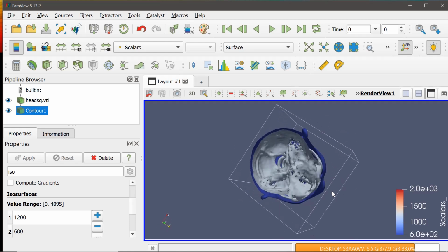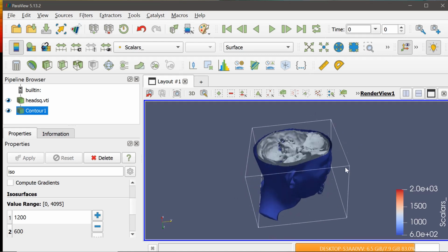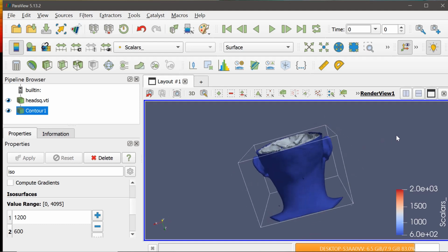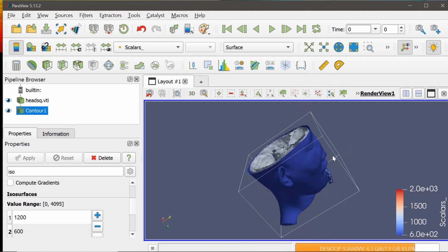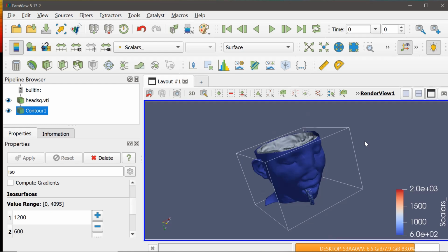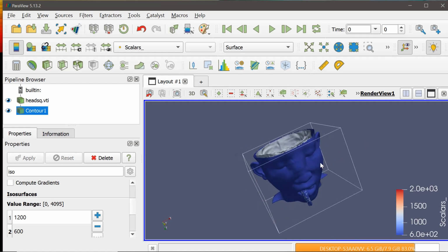and you can see how that plays out. You're able to see how the morphology of a human being is composed. You can clearly see the skin sits gently on the skull properly. So some of these things can be used for understanding human anatomy. So basically that's it for isosurfaces.